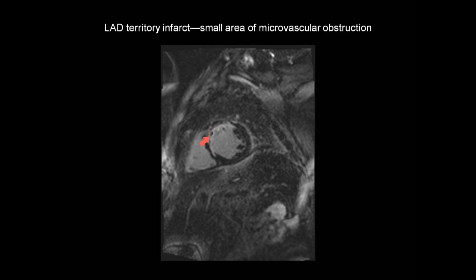But if you look carefully, you can also see a dark area within the infarction itself. This is an area of the infarction but the gadolinium contrast has not been able to reach, and that's why it appears dark rather than bright. And the reason that it hasn't reached that area is because of microvascular obstruction. This is either because of small pieces of clot and debris blocking the vascular bed supplying this area, and also edema of the myocardium resisting the flow of blood into that area. So these dark patches are indicative of microvascular obstruction.